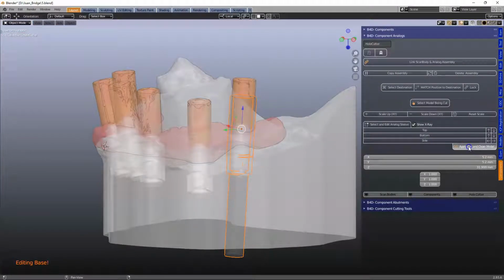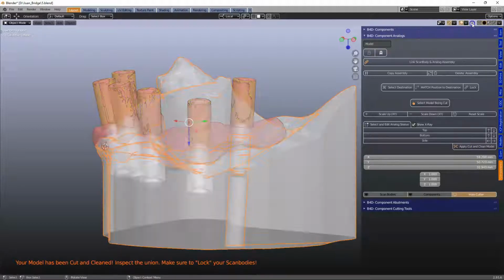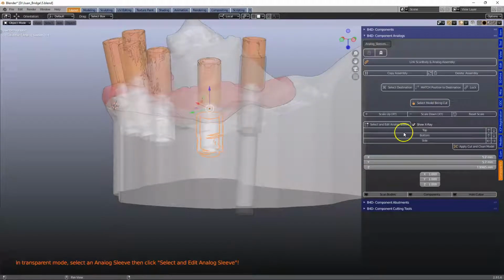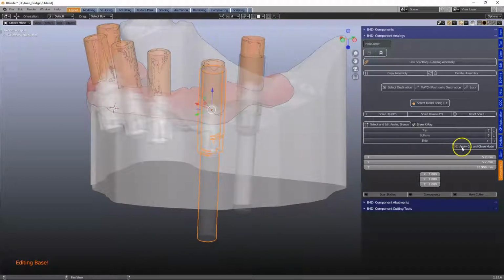Then we're going to cut this one, and then we're going to just quickly inspect to see if it is cut, which it has. This is actually quite important, just to make sure that the Boolean unions and differences always work. So here again, up and down, make sure it extends outwards, and apply.